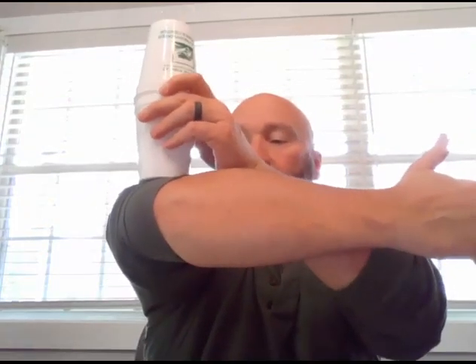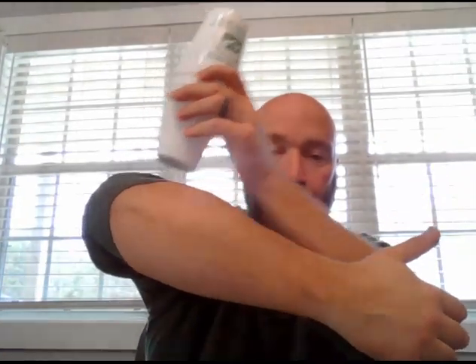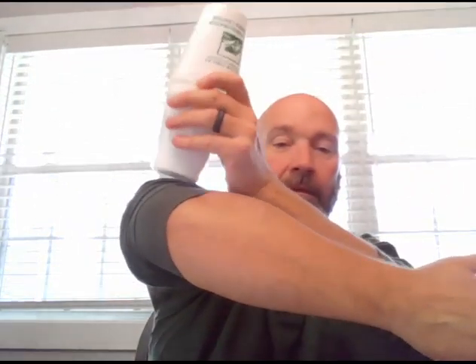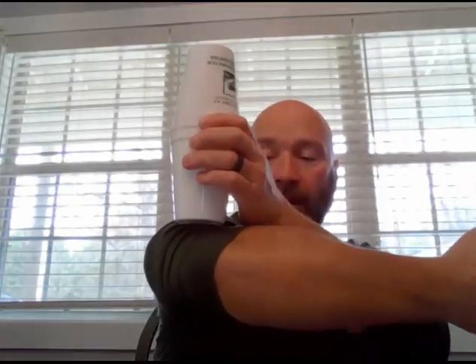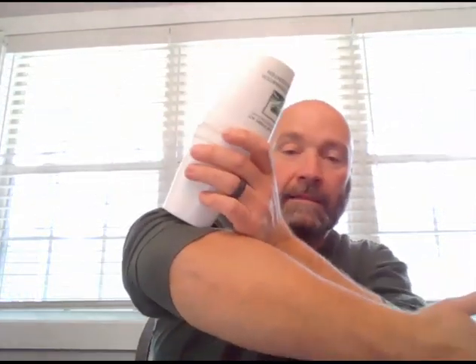If we've got a situation where we've got big old fat Popeye forearms and skinny wrist, then it's going to be anterior to, again, because we're considering the anatomy of the humerus and not the forearm itself, but it's going to be anterior. The capitulum will be anterior.